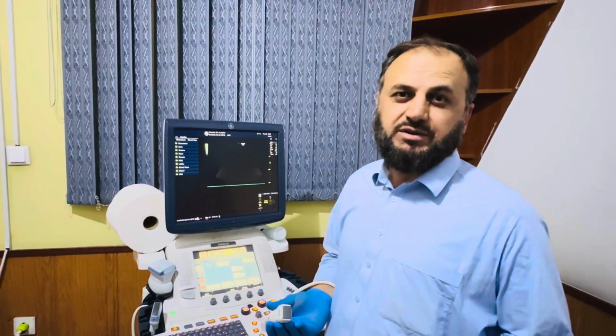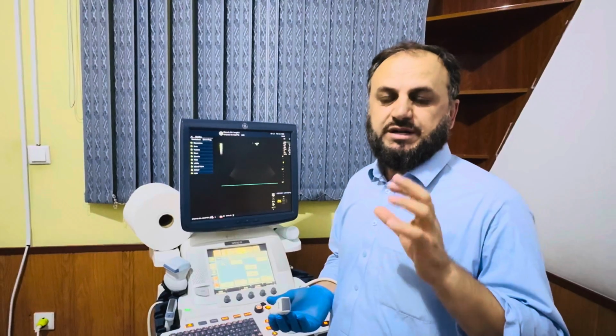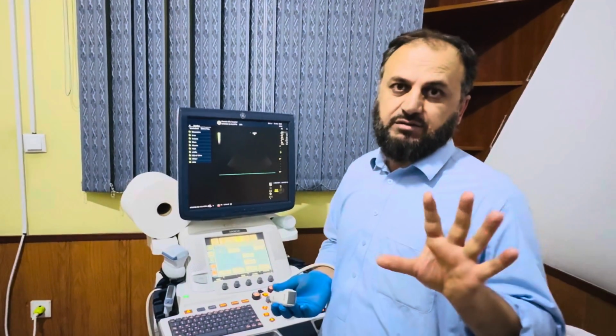Let's discuss the 5 windows of echocardiography, adult echocardiography. Maybe you may have a patient in an emergency room or somewhere. So where is a crash protocol for that? Easy and simple. We have 5 windows, as you know.